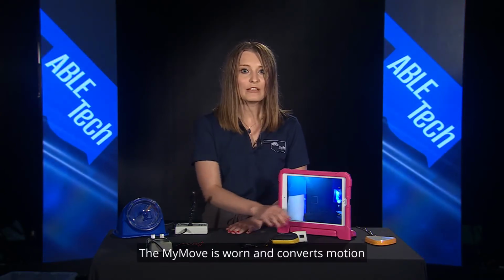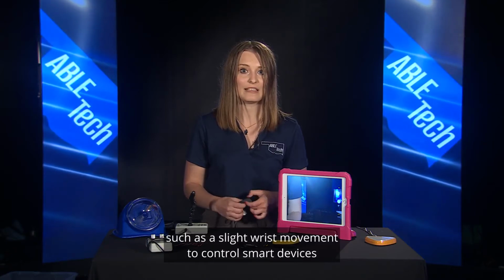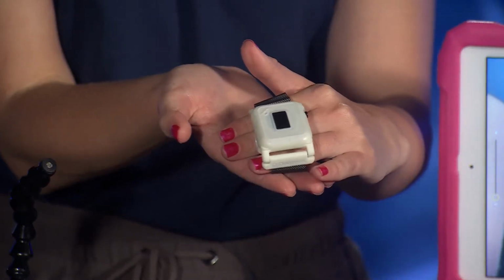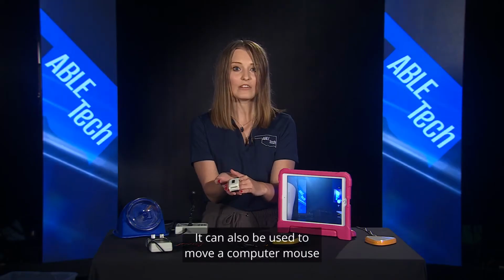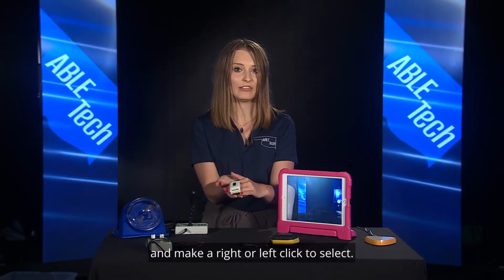The MyMove is worn and converts motion, such as a slight wrist movement, to control smart devices for individuals with limited range of motion. This can be used in place of a finger on a touchscreen to select or swipe. It can also be used to move a computer mouse and make a right or left click to select.